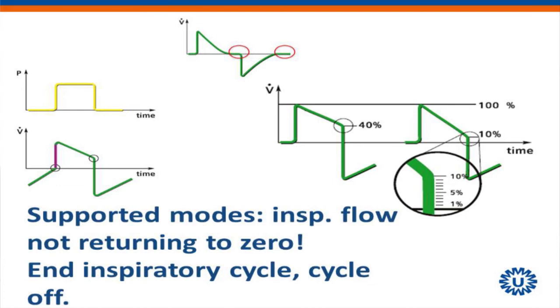When you're looking at controlled ventilation, volume control, pressure control, when does inspiration go over into expiration? We saw that we targeted the pressure or the volume and put a frequency on the ventilator, and that the flow was mostly returning to zero. But in support modes, that's different.